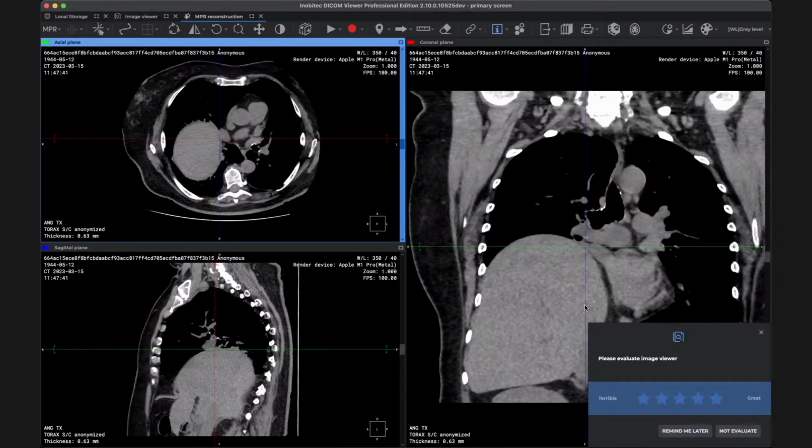And I think that's it, everyone. That's our final case. Very good, very good. I'm impressed how skillful you are in the program.